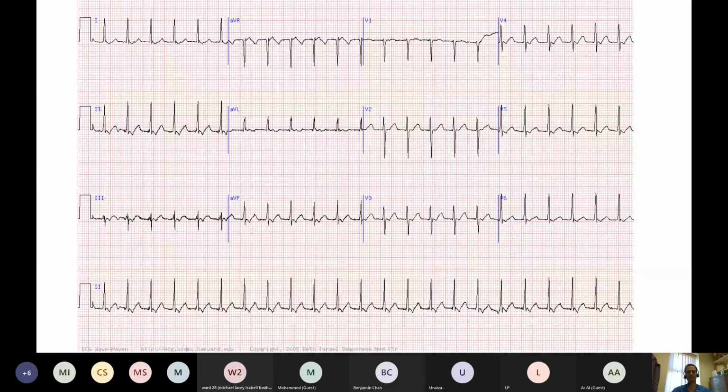Yeah, it's about 150 again. So here, can you see it's fractionally longer? So actually, it's probably about 145, so slightly less than 150. So we should immediately be saying, is there a flutter wave? And I think if you look here just before the QRS, it looks pretty flat. So we can't see any evidence of a flutter wave. You also can't see any evidence of a P wave.